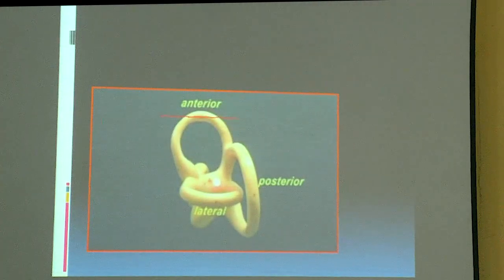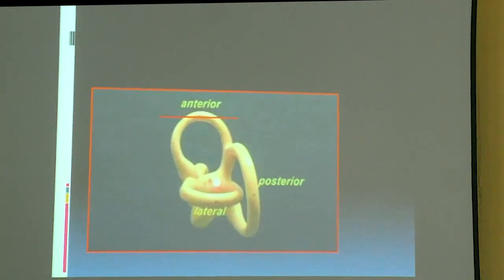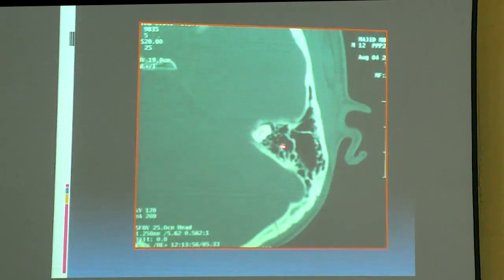One more thing is, if you are cutting a semicircular canal here, what you will get on the plate is something like this. You will see a black line in the midst of the white of the otic capsule. But if you cut it lower down, you are going to see 2 little dots. So that is how you are going to follow your semicircular canals, right? So let's see from above. This is the arcuate eminence, and just below it is the superior semicircular canal.